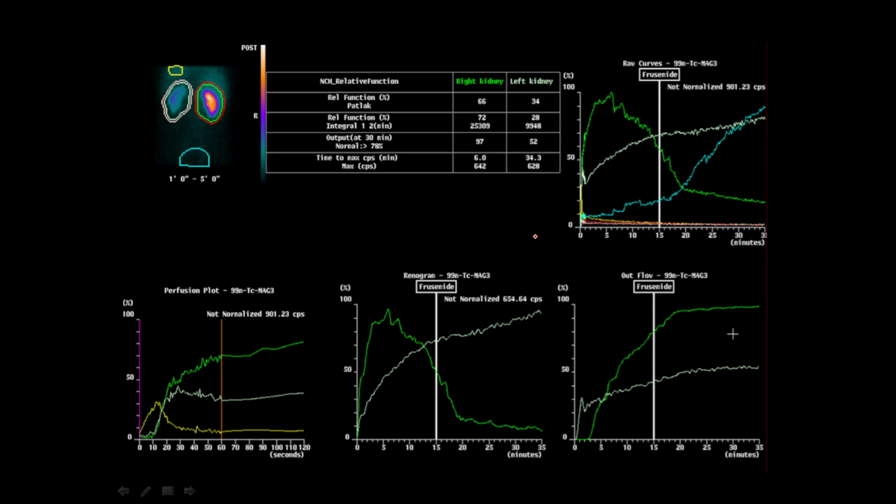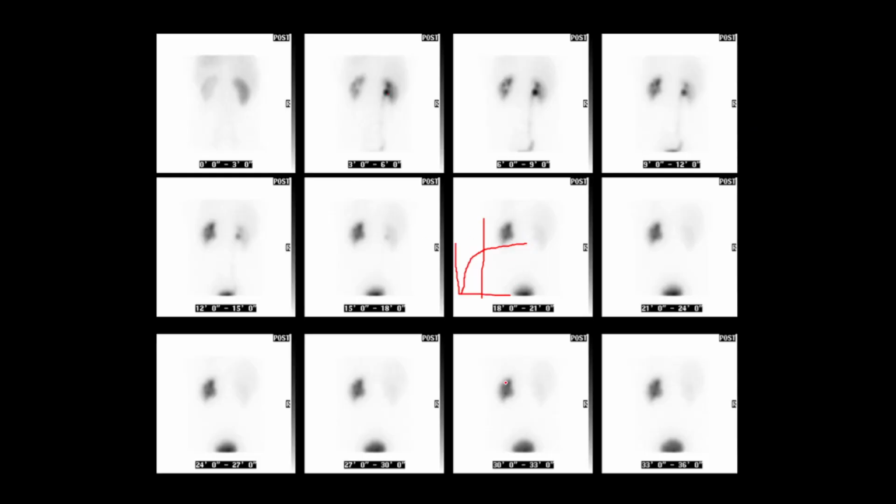So this patient has obstruction at the level of the renal pelvis here. It's usually due to a PUJ obstruction. Of course, it could be due to tumour or a stone, but we would hope that those other causes would be excluded first before we evaluated the patient for a PUJ. So usually these days, the patient will have had a CT urogram or some sort of CT, and you'll be able to see if there's an anatomical lesion there. Or they might just have had an ultrasound and have classic appearances, in which case it's fine to go ahead.